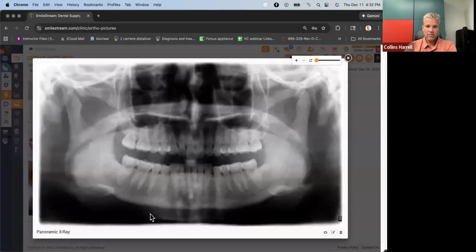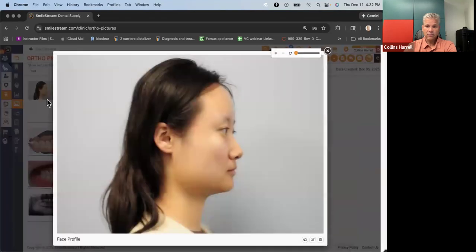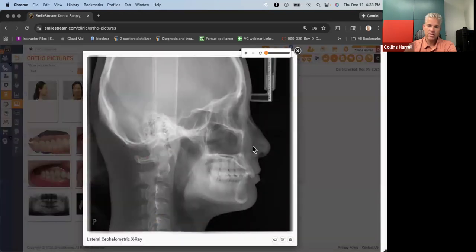And nice, clean looking panoramic. Profile's a little bit full, but straight when you go from nose to chin. So I'd probably be looking to maintain that profile and try not to flatten out any more. So let's have a look at the case without the Ceph.